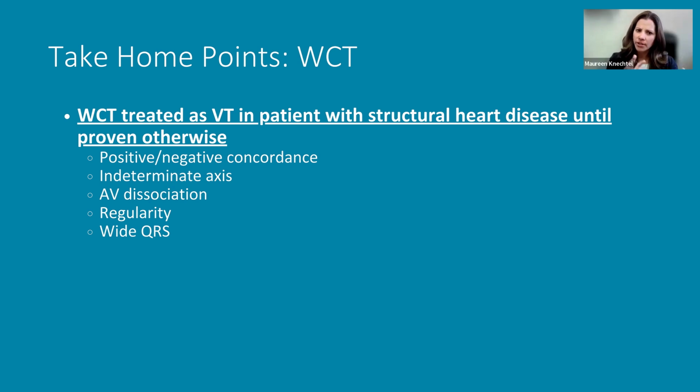And with the precordial leads, you essentially want to take the vantage point: as electricity is moving past me, what am I seeing? If I'm lead V1, everything's moving away normally. That's why lead V1 is predominantly negative. QRS is predominantly negative most of the time. That's normal. It's what it should be. V6, look at any given EKG that's essentially normal. V6, the QRS should be predominantly positive. Why? Because it sees everything coming towards it. Okay, so that's normal R wave progression.